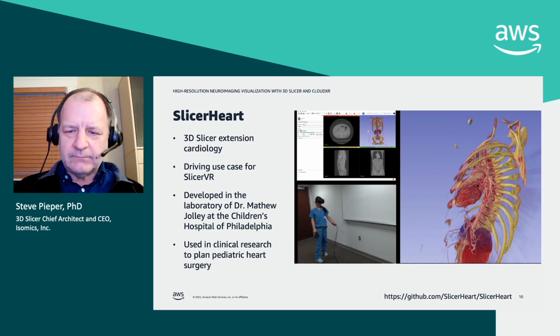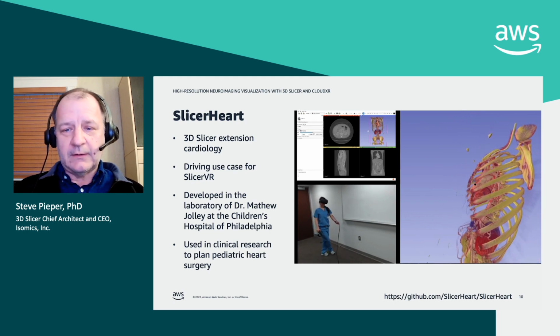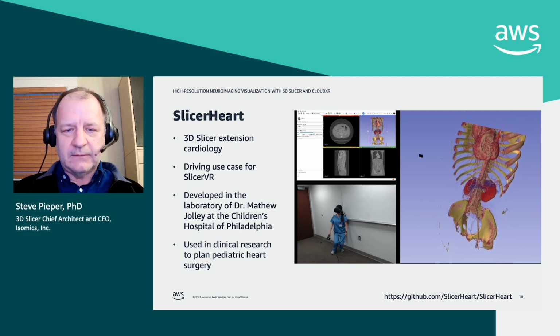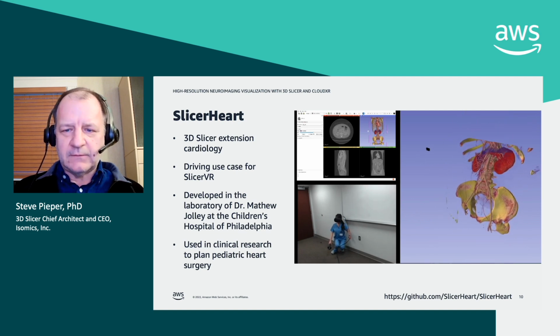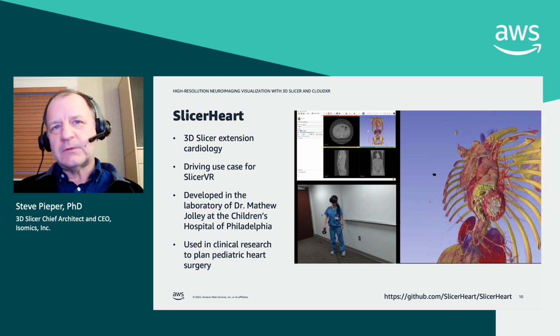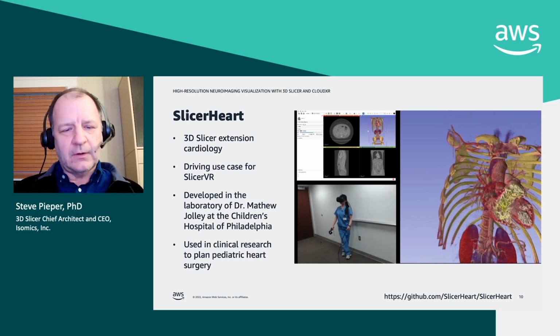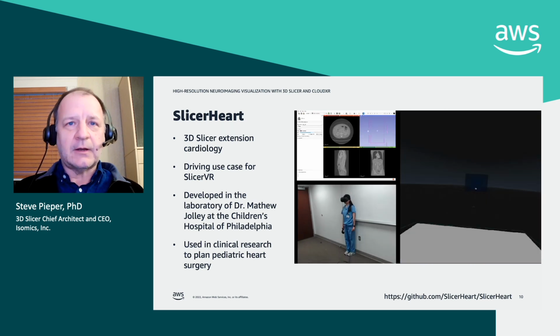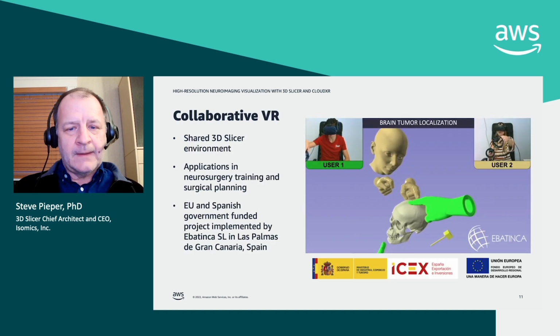This is a very good example of a high quality clinical CT scan. It's easily able to be rendered in real time on current systems. It's used pretty routinely now, and routinely under research controls for pediatric heart surgery, for visualizing congenital heart defects before surgery, or for the implantation of devices.